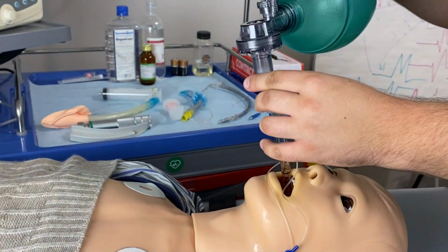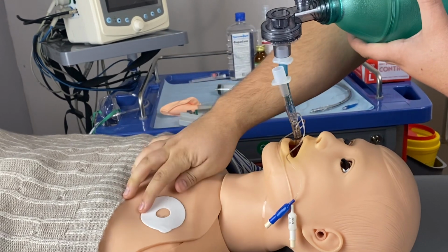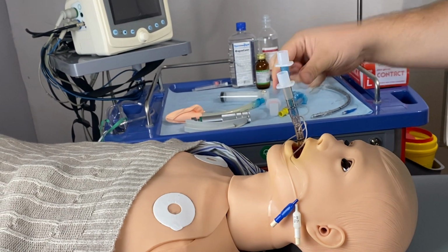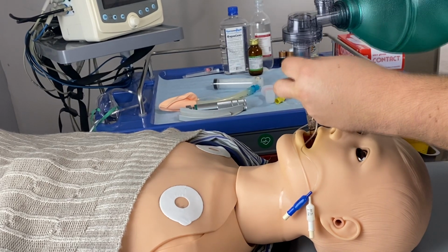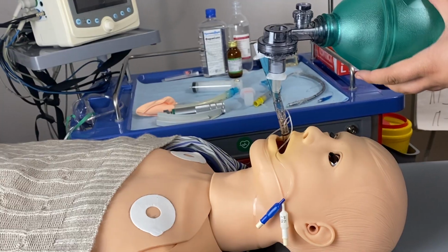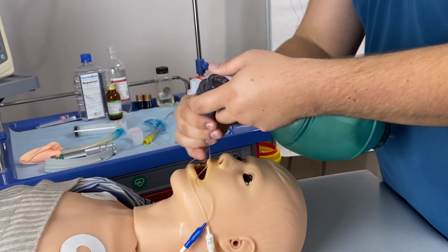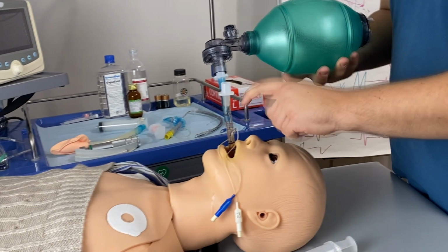And now we start with the blue port with number 1, ventilate. We auscultate and we see if the chest is rising, so if we are positioned correctly, we continue ventilation with number 1. If we see that nothing is happening, then we switch to number 2. It has the same connector. Right now the device is positioned correctly, that's why I have a huge resistance here on number 2. I cannot ventilate, but I don't need to as long as I have a normal airway access on number 1.